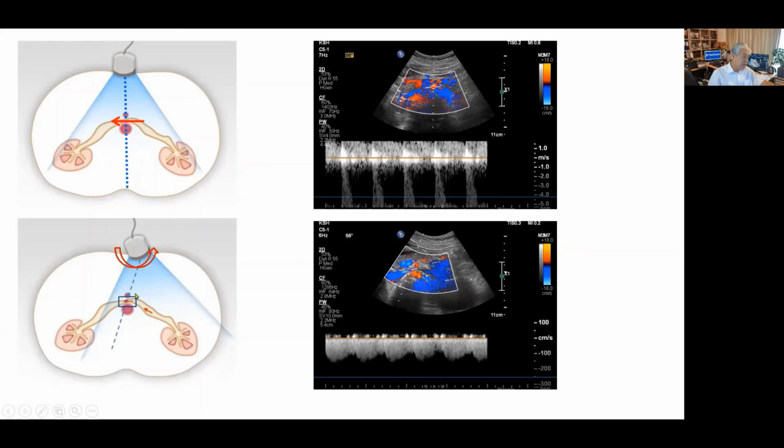and superior mesenteric artery. In this spectral Doppler ultrasound image, the sample volume is located in the left aspect of the imaging field because the transducer was rotated counterclockwise, and we may get clear Doppler spectra because the sample volume is wide enough.